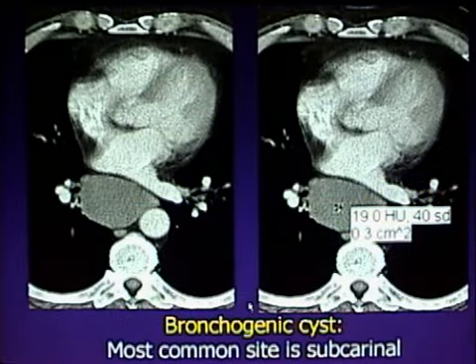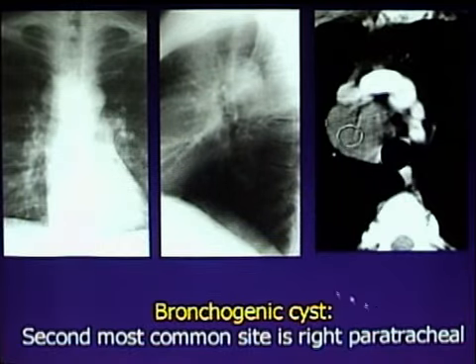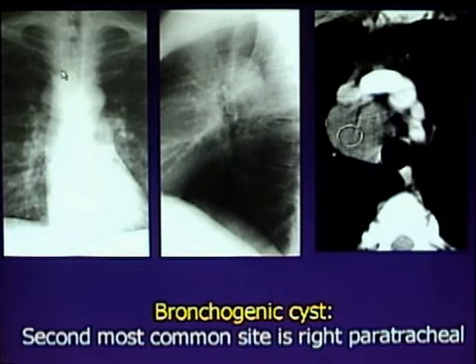So here's a typical bronchogenic cyst in a typical location, the most common location, in fact. We have a relatively large, homogeneous, low-density structure in the subcarinal region. It's displacing the heart a little tiny bit. Densitometry measurements are around 19 Hounsfield units. This is quite typical. Second most common site, as I said, is the paratracheal region.